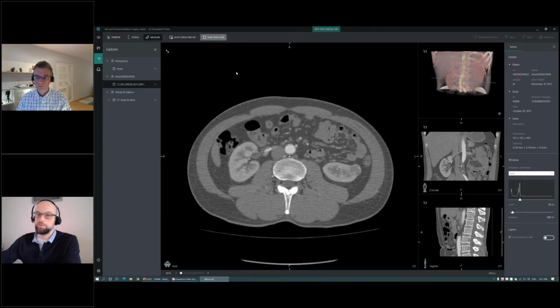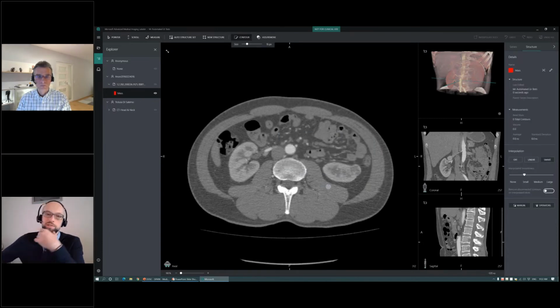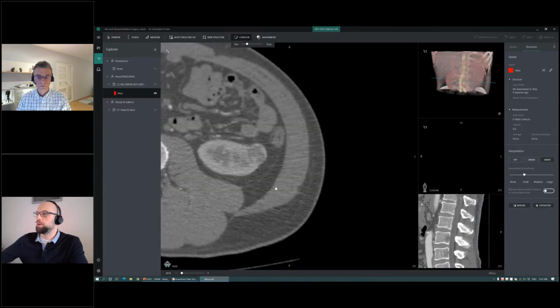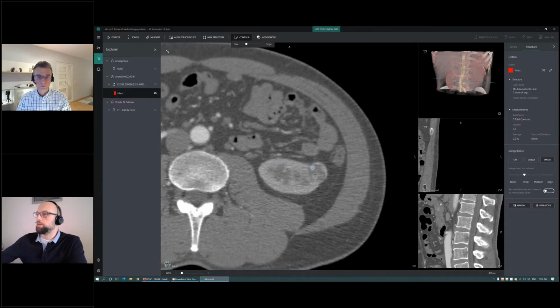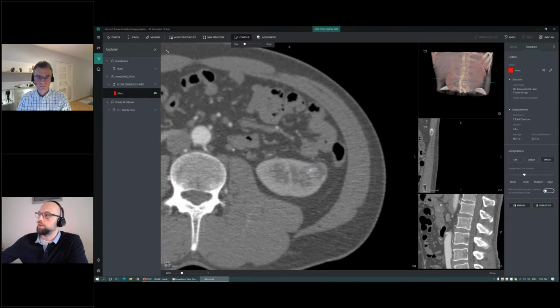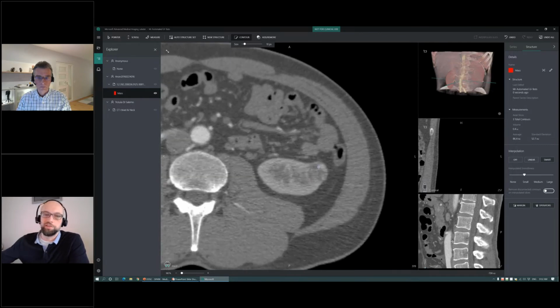So for that, radiation oncologists would say, okay, I have an image like that. This is a CT scan, computed tomography scan, of somebody's abdomen. It has a mass here on the left kidney, and traditionally radiation oncologists would draw a contour on this mass. Since it's a CT image, it has multiple slices. So this is just one slice. I switch to one slice above, I draw another contour. I switch to one more slice above, that's another contour of this mass, and so on. So this mass spans maybe 20 slices here, maybe a bit more. So there's a lot of fine contour drawing.